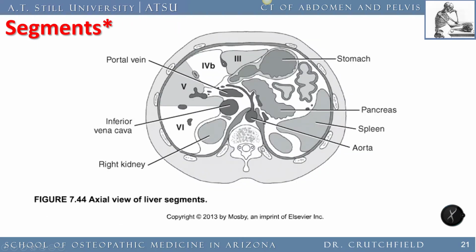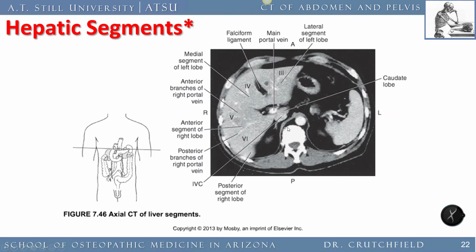Again, in this caricature, we're looking at aorta, and then we are most likely at the celiac trunk, where it's branching into a left gastric and a common hepatic. Here's the inferior vena cava, and immediately adjacent to it, we see the portal vein. Of course, we have the different segments. Please don't memorize the segments. Stomach. And in our next image, we need to look to see if we can pick out portal vein and cava. So again, here is portal vein.